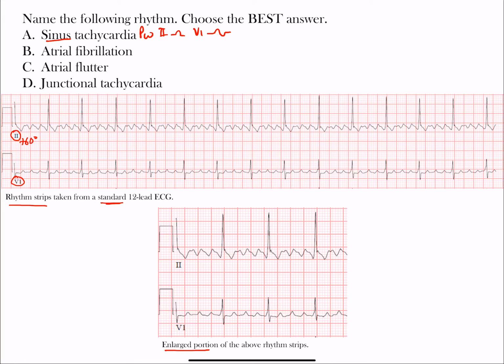Tachycardia, or other things of sinus rhythm we should keep in mind. Normally, this is a regular rhythm. You can have sinus rhythm that is irregular, but that tends to be with a block. Now, tachycardia means that we have a fast rhythm, so over 100 beats per minute. Again, tachycardia is over 100 when we're talking about our adult patients, and make sure you're assuming that unless I tell you otherwise.